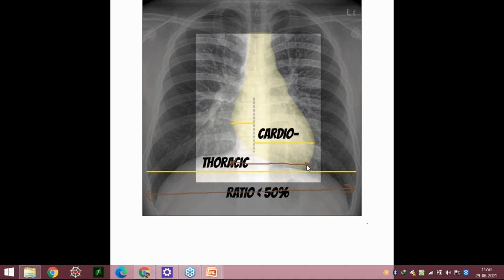I hope everyone has followed. If you can imagine, this would be the arch of the aorta. अगर हम anatomy देखें, obviously that is not visible entirely on this X-ray. It may be visible in which condition? The arch of aorta can be completely visible in which condition on X-ray?